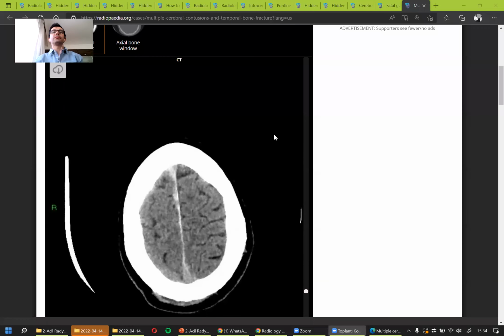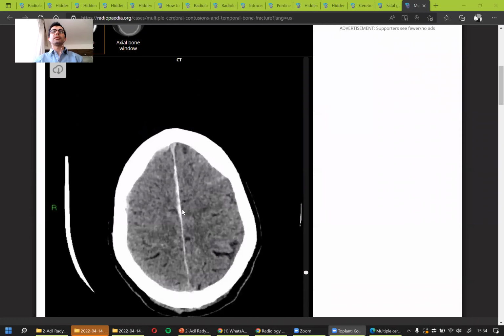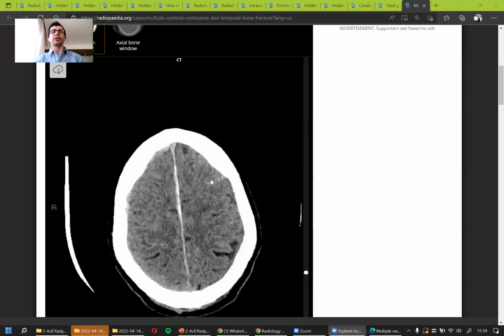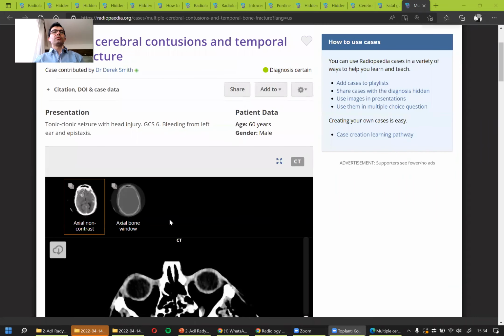Okay. There is some small area of bleeding here as well that I'm detecting, which is this one here. So this is also another area of subdural bleeding because it's very thin. It doesn't have convex angles. It doesn't make any convex angles with the dura, and it's due to the trauma as well. Another area of subarachnoid hemorrhage. Okay, this is pretty much it for this case.